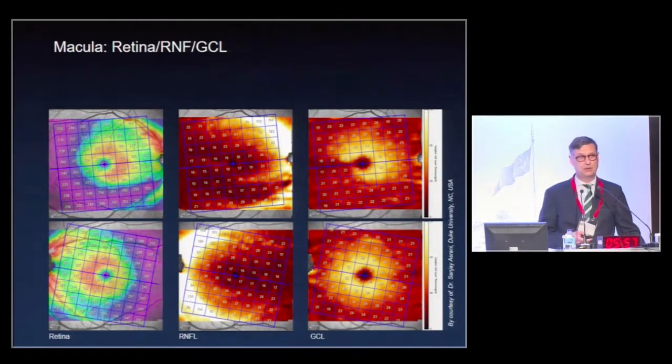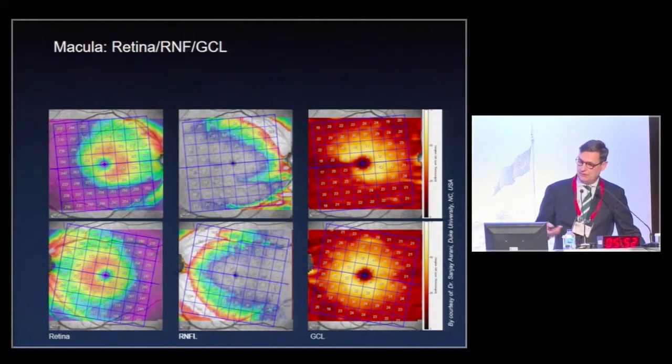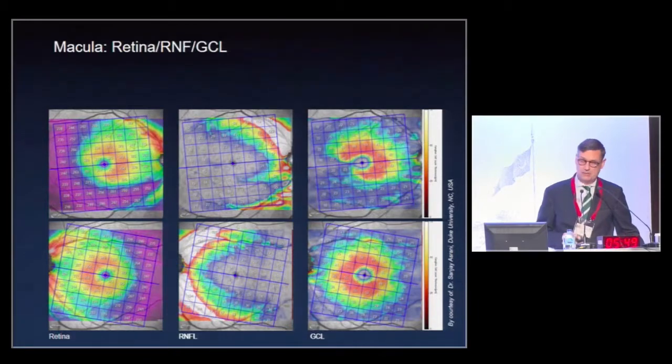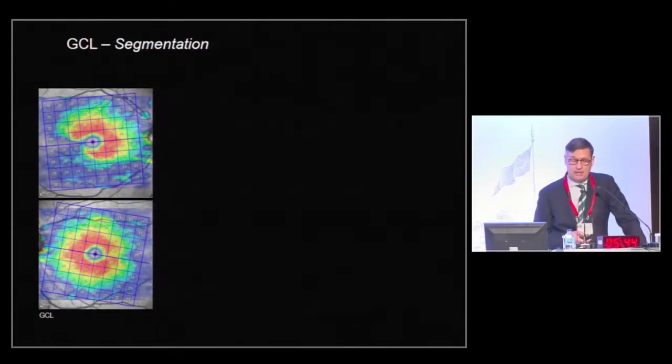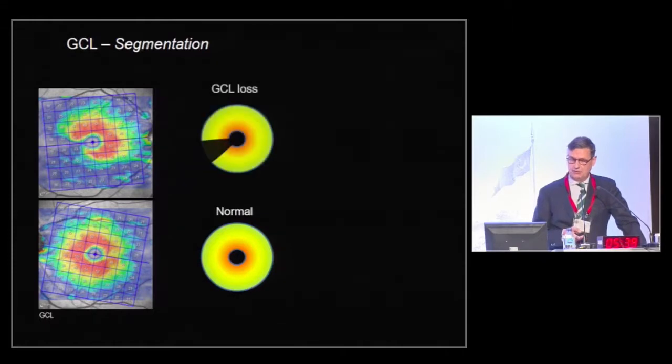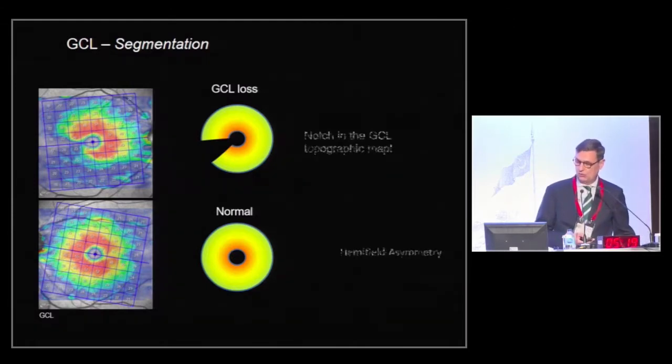But what's best is to look into the ganglion cell thickness, which is readily imaged in this heat map or in this rainbow colored map. When you compare a normal ganglion cell donut in the inferior with a patient in the superior, you will realize that the donut gets an edge, and ganglion cells are lost sectorially, which always corresponds to a nerve fiber layer loss in the nerve fiber layer ring measurement, and gives you a sign that the patient has progressed glaucoma.